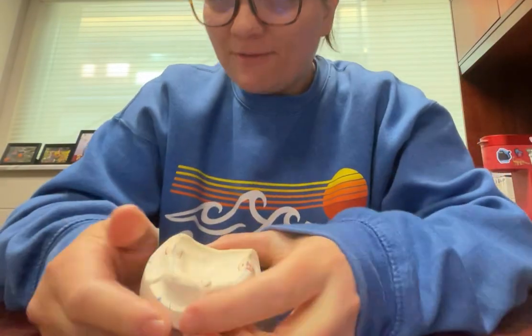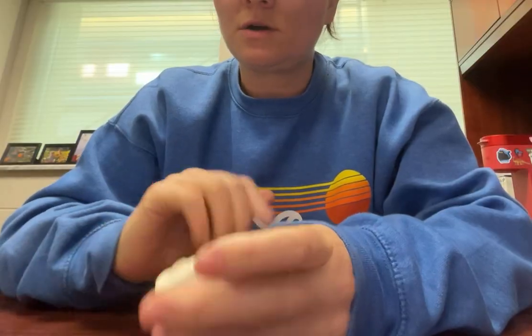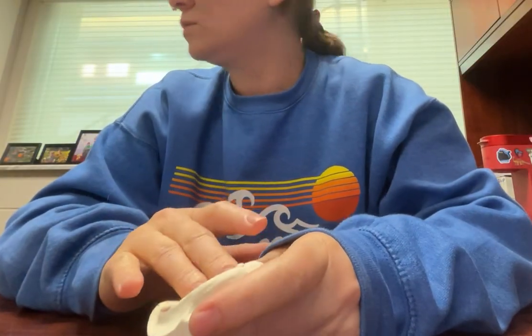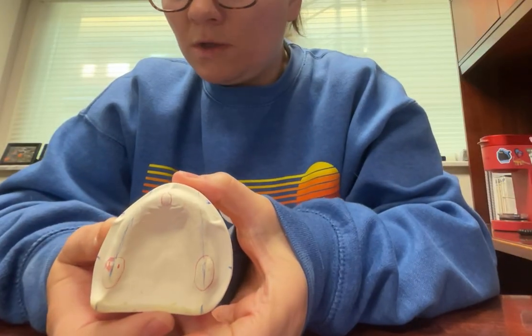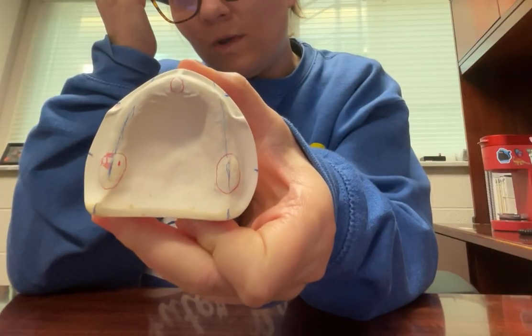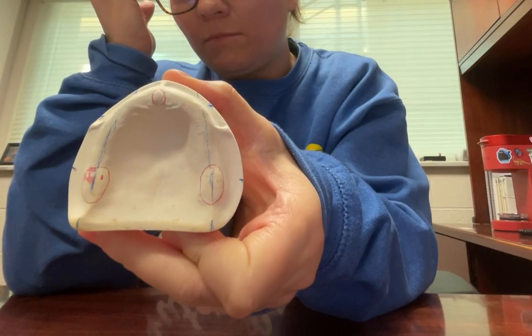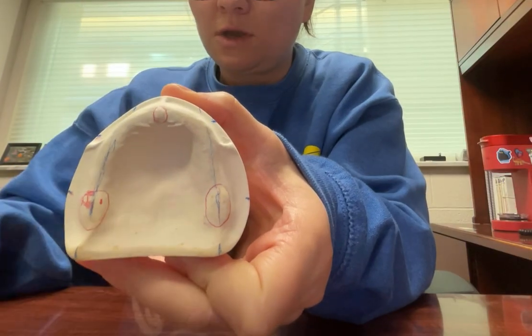That's okay. Hi friends, I have had a lot of you ask me about the lines that we do on our record bases and rims and why we do them. So I drew these, but I will redraw them for you. This is the lines that we want on our maxillary cast. We don't grade these for the practical, but it's important to know what they are and what they mean as you go through your tooth arrangement.